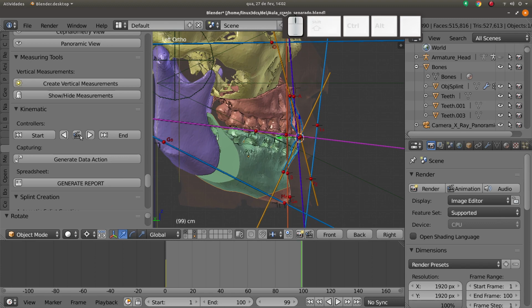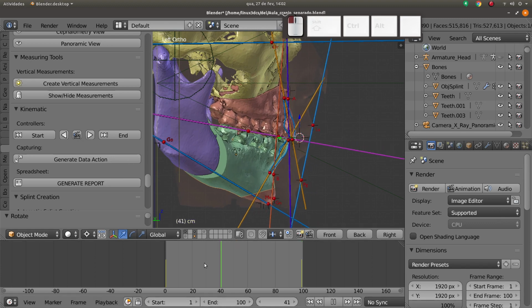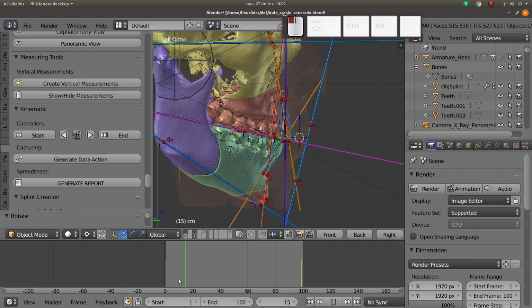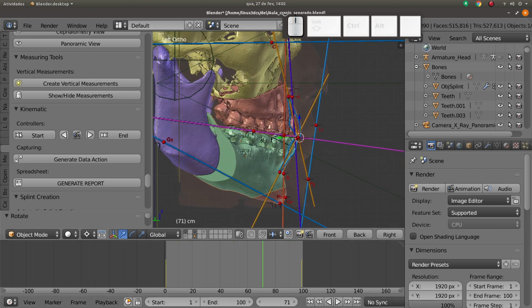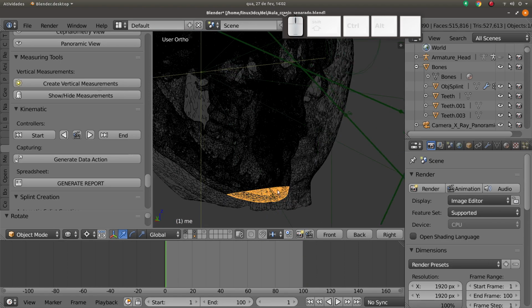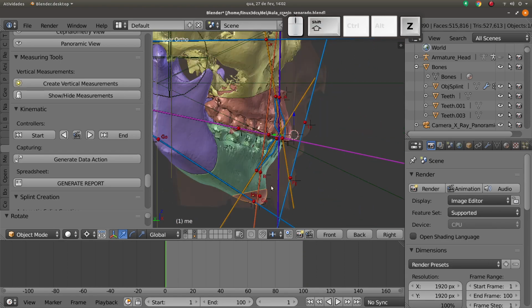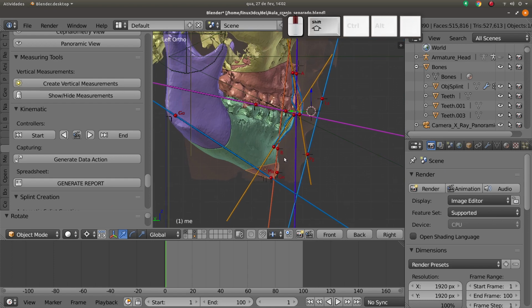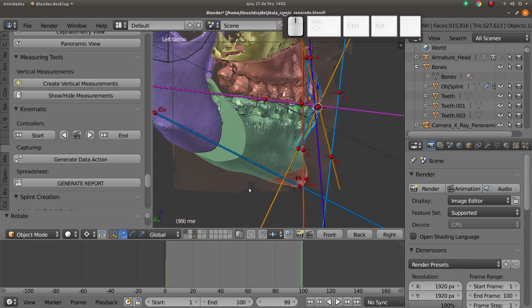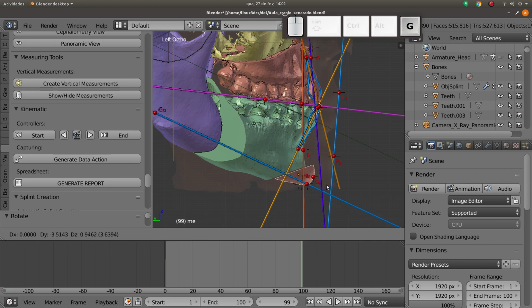And I click on this icon, and I now have an animation of the two positions. Okay, and the same thing I will do with the chin. But look at an important piece of information. I put here, in the first click, the animation, the first frame. I put the end frame, and I move until the position I want.